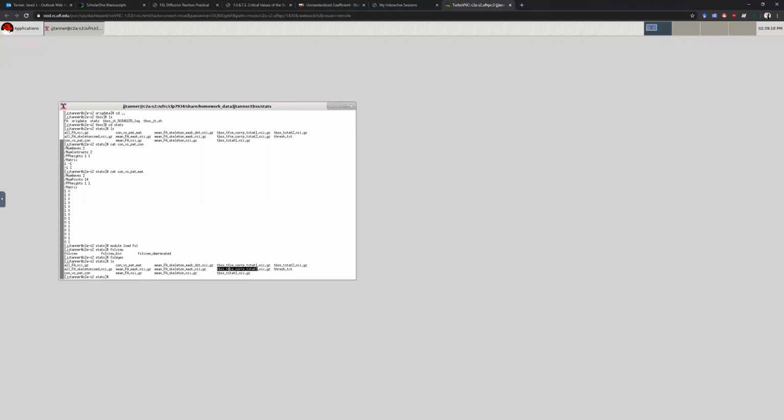We could also look at these corrected p-values, the TFCE, the threshold-free cluster enhancement, these corrected p-values. The downside of that is we only have 7 participants in each group. If you had a large sample size, at least 30 in each group, or 40 or 50 in each group, again, a bigger sample size, then we can be more comfortable using these corrections for multiple comparisons.